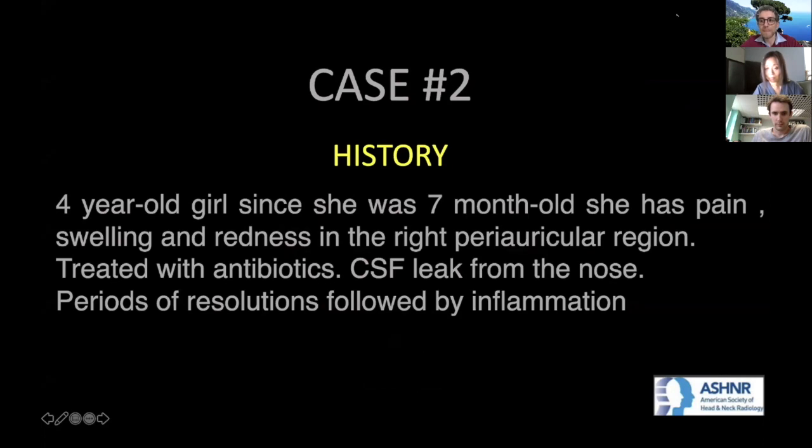And so what we've been doing is we call the ones like your first example a cystic cochleovestibular anomaly, recognizing that it's somewhere in the spectrum between a common cavity and the more defined versions of IP1.